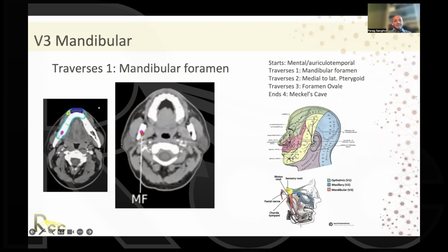So here is the mandibular foramen, and you can see as you're contouring this, your CTV really needs to generously include all of that mandible. As we all know, we go out of our way to spare mandible all the time for most of our head and neck patients. And here you really can't spare the mandible. And you can see here's the mandibular notch. Here you can see on the left side, and that's where the mandibular foramen and the mandibular nerve is going to traverse through. So you're going to contour that notch right here.